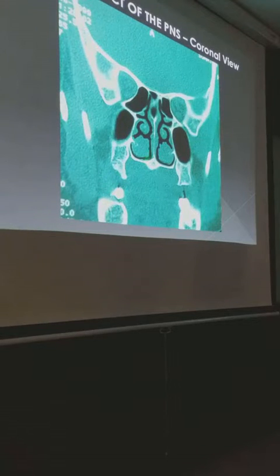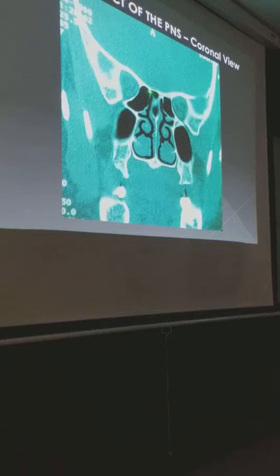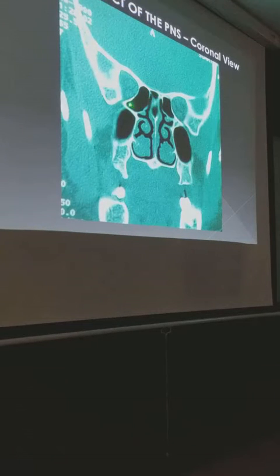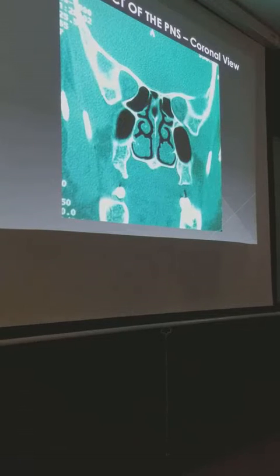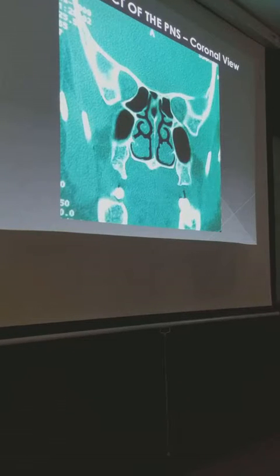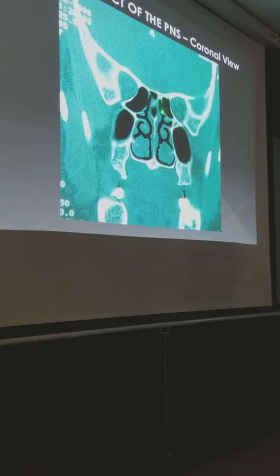Okay, now, so that's clear. If your turbinate is in a horizontal process, the palatine bone is clear, right? It's really bony here, right? So that's really your horizontal lamella. Now, that's your skull base again. This is the problem now, see? So you see a pneumatized cell here. You see here definitely the rostrum of your anterior sphenoid. So that is now your last lamella, last primary lamella, of the sinonasal cavity. Uncinate, bulla, ground lamella, frontal sinus, sphenoid sinus, here. And then you see this cell here.